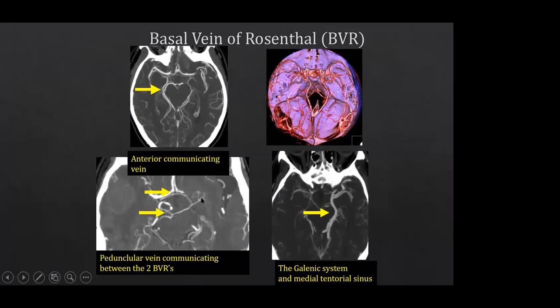And this is just to show you some variation. You can see how the blood is draining predominantly on the left side, and hence any abnormality, any venous hypertension affecting the right side is also going to reflect in the left side of the brain over here.